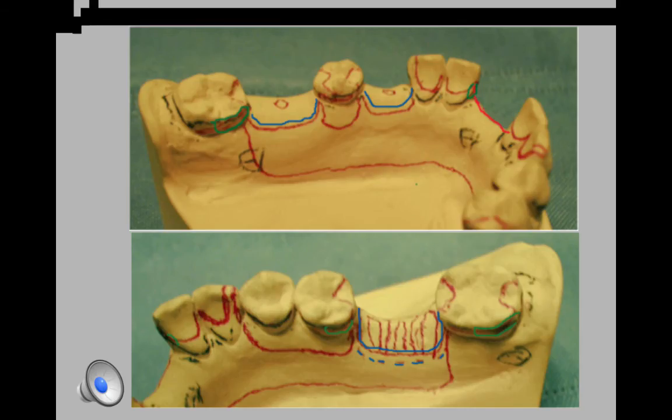This slide shows you two replacement mechanisms. The upper one has tube teeth in the posterior area, and the lower one shows you some base attachment and what it would look like. The advantage of the base attachment is that it can be relined, whereas the tube teeth will not have that option. The facing also cannot be relined that is used in the anterior on this mandibular arch.